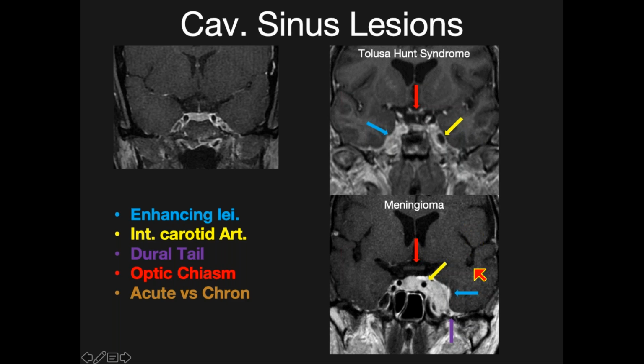Different patient. This has been going on for some time. They've got visual problems, and clinical examination shows involvement of cranial nerves, and this patient had involvement of III and V1. There's a big enhancing lesion in the left cavernous sinus, or involving the cavernous sinus. You also see some telltale signs. This is the dural enhancement here, and it's also extending towards the brain itself. It's all extra-axial. The imaging picture is that of a meningioma.